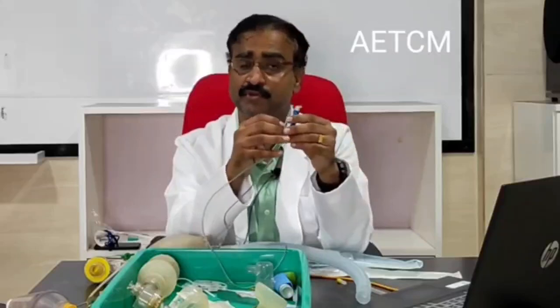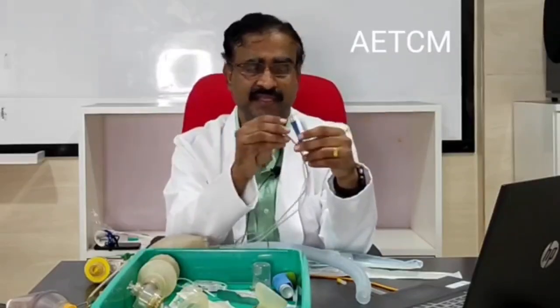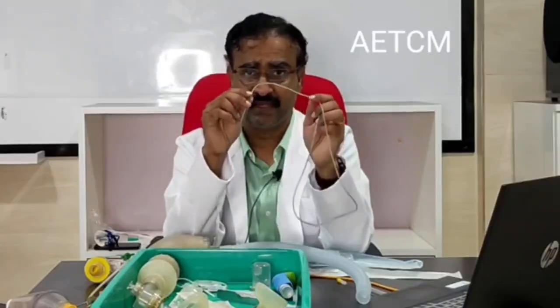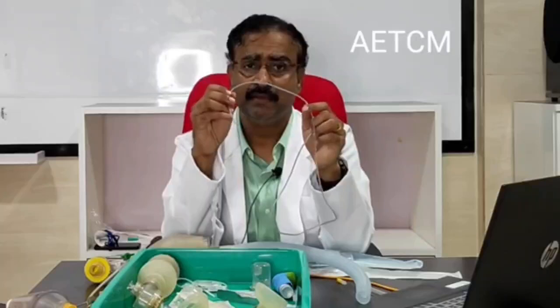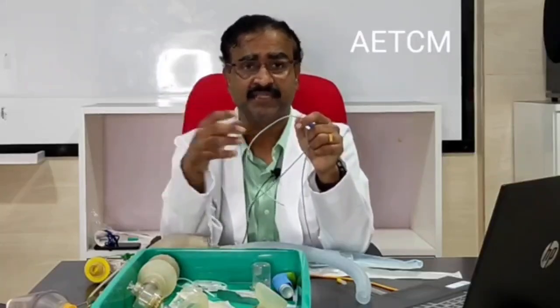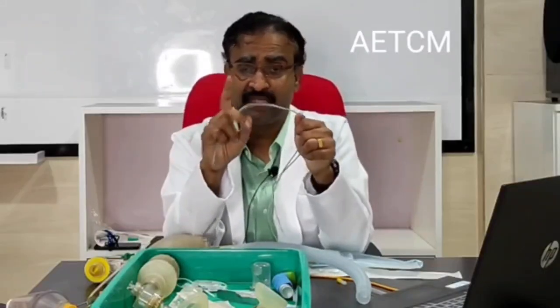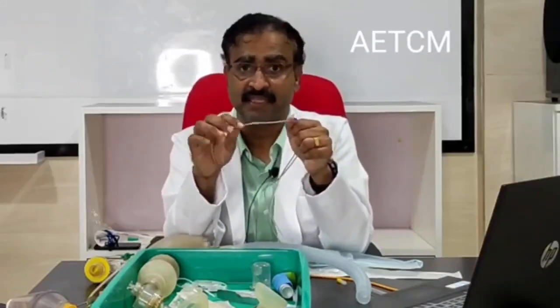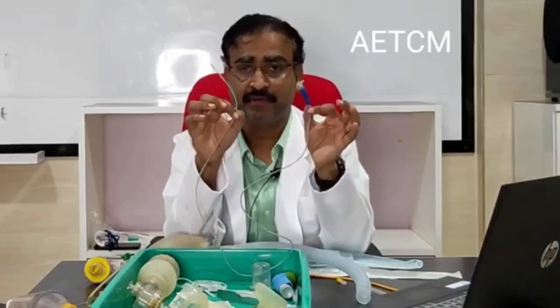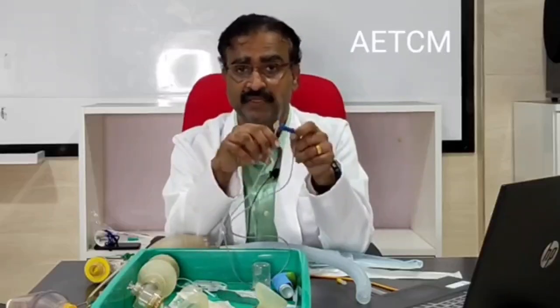Once you have done that, we should know what the uses are. You have diagnostic as well as therapeutic uses. The diagnostic utility is, once this tube is inserted, you can take out samples and send them for toxicology analysis. So in a child with unknown poisoning, not for corrosive, but for unknown non-corrosive poisoning. In a corrosive poisoning, this is an absolute contraindication. Do not do it, because you could actually rupture and puncture through the GI tract. So you don't want to use this.